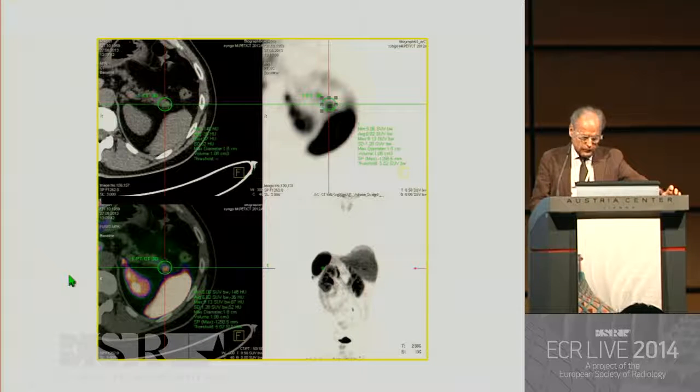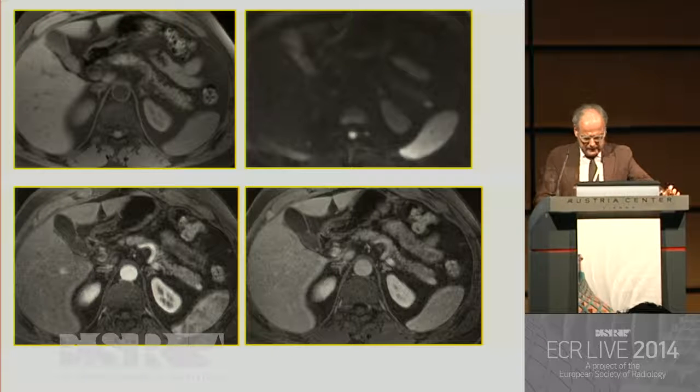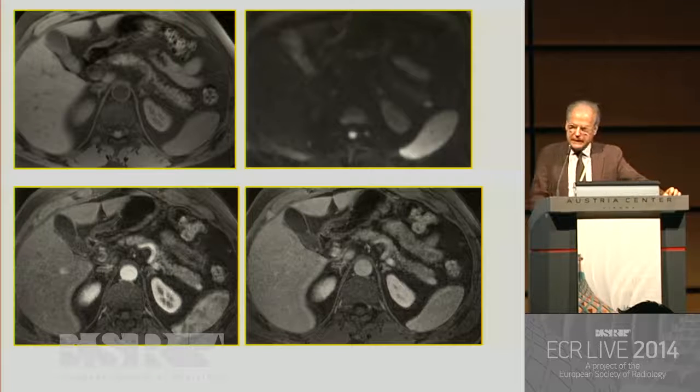And so also for this patient, the hypothesis of neuroendocrine tumor was proposed. This patient was examined by us with magnetic resonance imaging, probably on the basis of that previous case, which we had experience of.